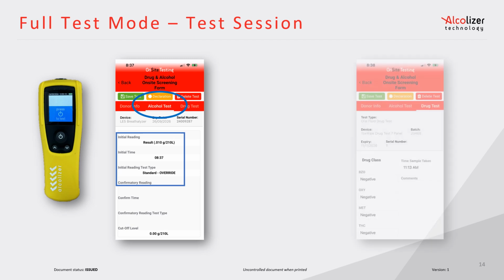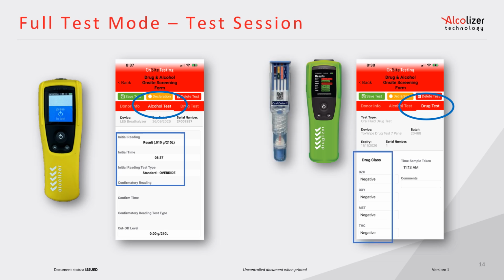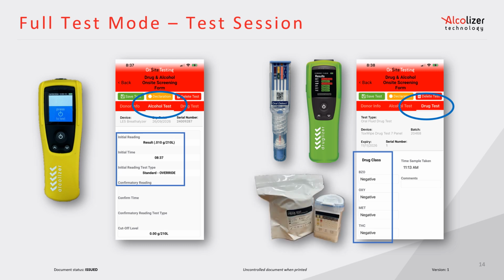Open the drug test form to receive a drug test in the app using the Druglizer. Send the drug test to the app. The results will populate the form. If you are using an oral detect device or conducting a urine screening test, manually enter the results.